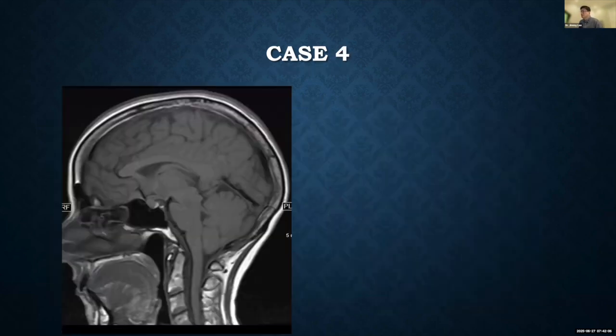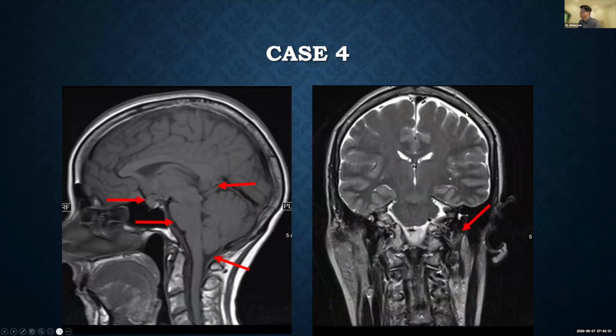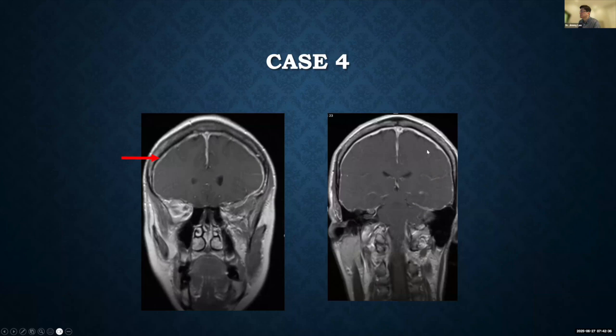Another low-lying cerebellar tonsil. So what do we see here? Remember the imaging findings from the Bern score and all that, right? Here's a effaced suprasellar cistern, plump pituitary, sagging brainstem, lower-lying splenium of the corpus callosum, low-lying cerebellar tonsils. Coronal T2 shows the subdural fluid collection. Post-contrast shows pachymeningeal enhancement and a little bit distended sagittal sinus. So this is intracranial hypotension.